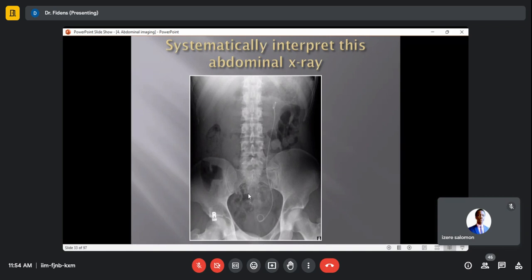I go now for the intestines, because remember, they are part of S, soft tissue. I check peripherally. I can see the cecum, the sigmoid colon, but in the sigmoid colon there is fecal material. That's too much for a normal one. In the transverse colon there's some fecal material, then splenic flexure, descending colon, sigmoid, and rectum. What I can say is there is abnormally excessive impacted fecal material. This is a case of chronic constipation, nothing else. That's how I approach this X-ray. Thank you very much.